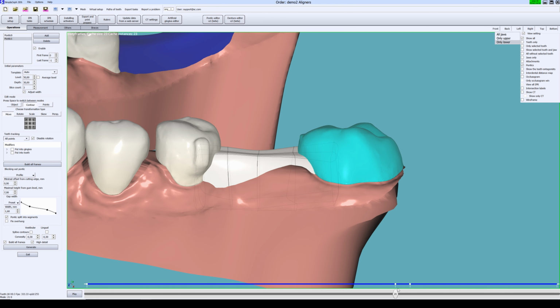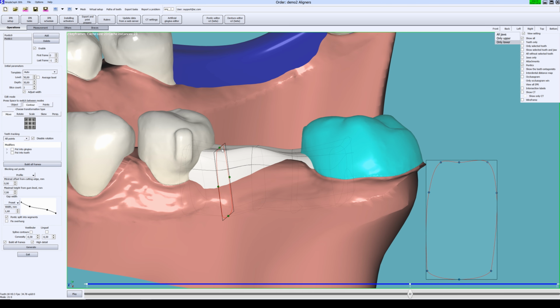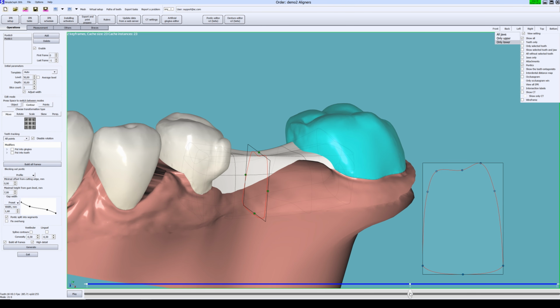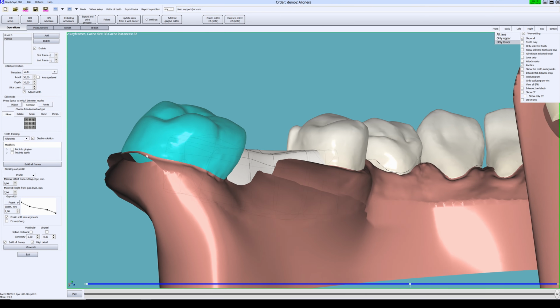To delete a useless keyframe, hold Shift and click the left mouse button. I want to make the rest of the modification for this keyframe and I use tool move. Take a look again at how the pontic looks and how it transforms. It looks finished. That is not all I wanted to show you.